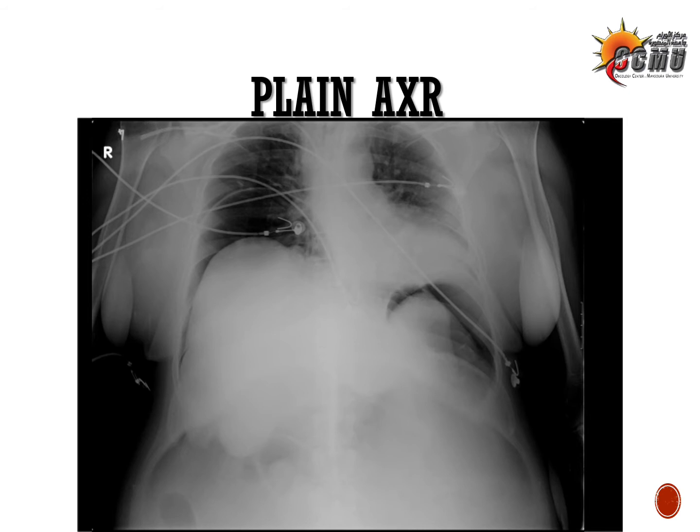So you may encounter such a film and not be estranged or perplexed because, for example, this patient is a patient in the ICU and she's having an X-ray of the chest and abdomen with the ECG connected to her.